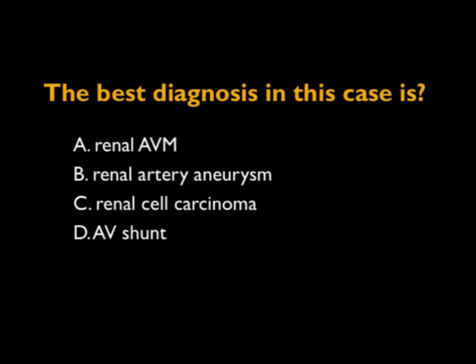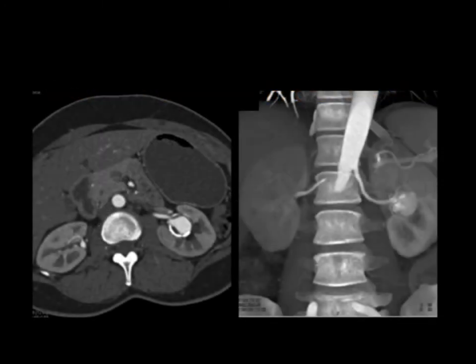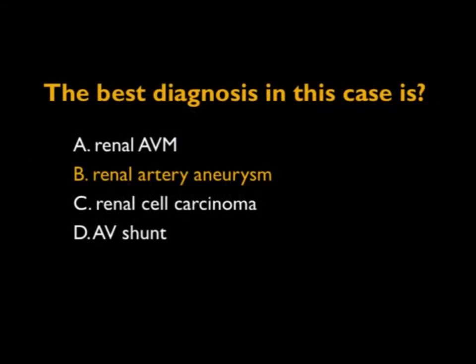This is somewhat of an easy case I saw recently, but I thought I would show you this classic example of renal artery aneurysm over 2 centimeters, which this was. Patients typically get embolization or surgery, usually embolization. You can see it has a rim-like calcification, which is not uncommon, but it's well opacified. Aneurysms can be single, most commonly, or multiple. Very, very simple. This is not an AV malformation or AV shunt. You don't see any shunting or early venous filling. Just a very classic case, and that was kind of like an easy case. I just happened to like the images.